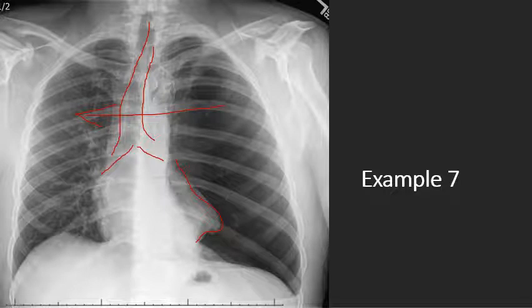This patient needs to have a needle thoracostomy right away to release the pressure so you do not have a tension pneumothorax, and then they need to have a thoracostomy tube placed in the 5th or 6th intercostal space, mid-axillary, in order to allow for the reinflation of the lung. So remembering that is very important because you don't want to be distracted by, oh yeah, what's going on over here, when there's a complete absence. And I'm sure none of you would miss this pneumothorax. This is pretty big.